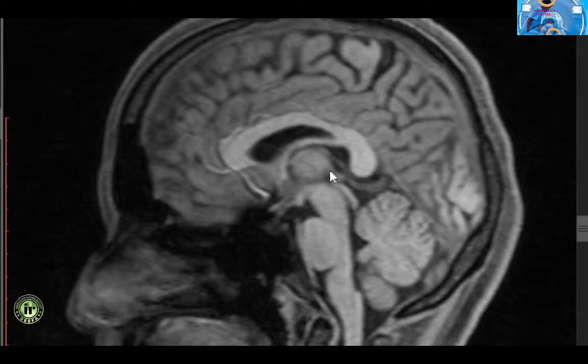The pineal gland is an ovoid gland situated between the two superior colliculi in the posterior wall of the third ventricle. Two laminae can be seen arising anteriorly from the pineal gland. The superior lamina is the habenular commissure and the inferior lamina is the posterior commissure. The anterior commissure forms the anterior limit of diencephalon. It consists of myelinated fibers within the lamina terminalis.